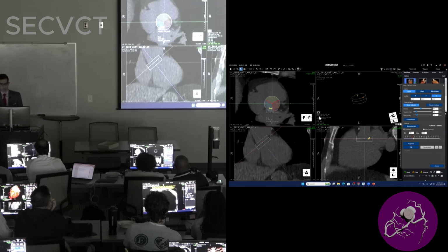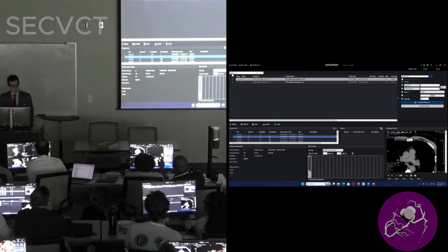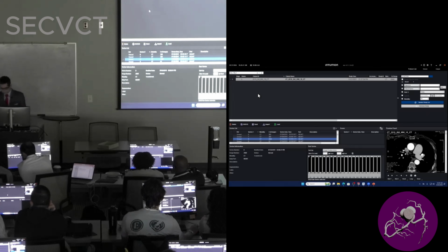We can do another case quickly, and then we can go to the TAVR where the money is, how to measure the annulus. All right, so let's go ahead to the patient list. And the same thing, just change the number from 07 to 18. Keep the same thing, that will be easier. So MW underscore 18 underscore CT.